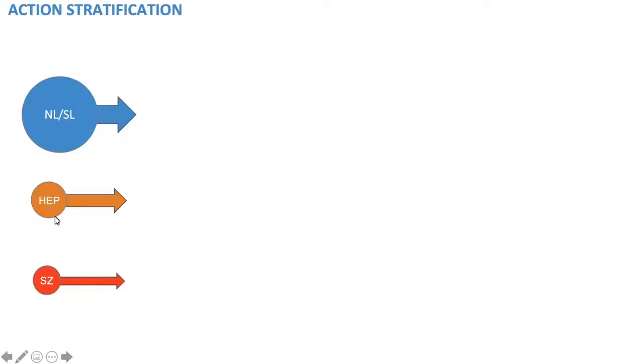circles is different because the majority of the time, if you have 100 EEGs, no matter what population you are testing, it's more statistically likely that the EEG is going to just show diffuse slowing or focal slowing or maybe normal.